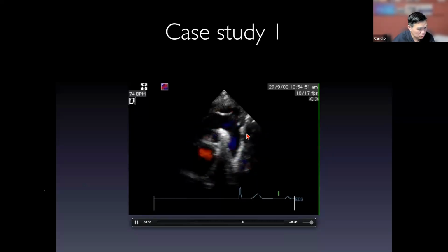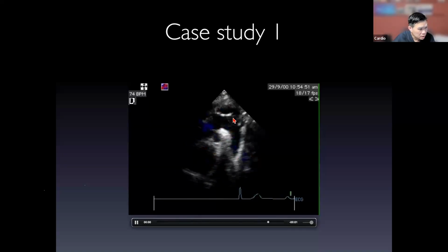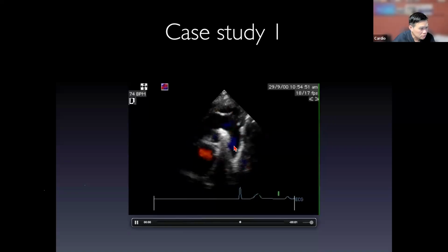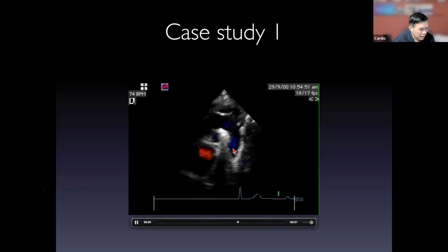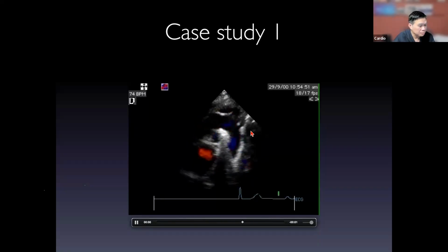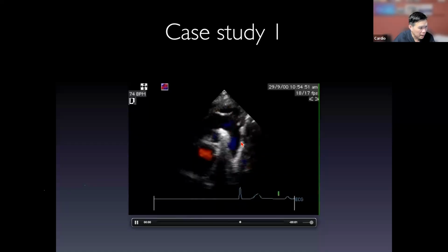So where is the mirror? The mirror is actually the far side of the aorta. When the ultrasound comes in, it insonates there and detects the flow differences in terms of velocity. But it also hits the wall as a mirror, reflects this way, and then comes back and goes back up. This is a very common artifact that we see, and it depends on the insonating angle between the probe and the wall.